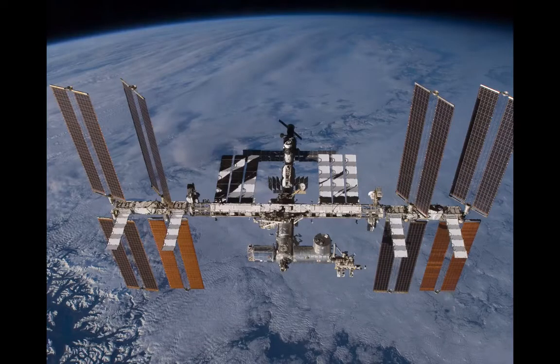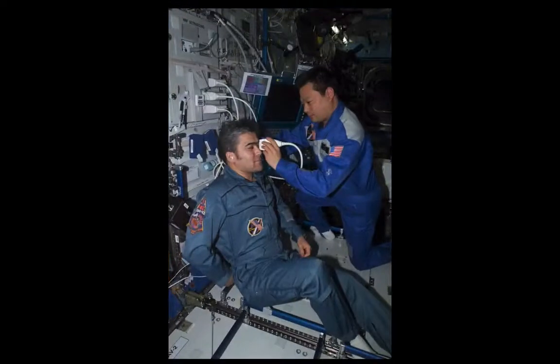And, guess what? In the space station, they don't have room, or they don't want to carry extra weight, so they can't put in a CT or an MRI up there. So what do the astronauts do? Well, they're trained in doing ultrasound. They look at a lot of parts of the anatomy that they want to check. If you think about it, you don't want to bring an astronaut down, do what's called a deorbit, unless it's truly necessary. So they examine themselves, and you don't want to bring them back.